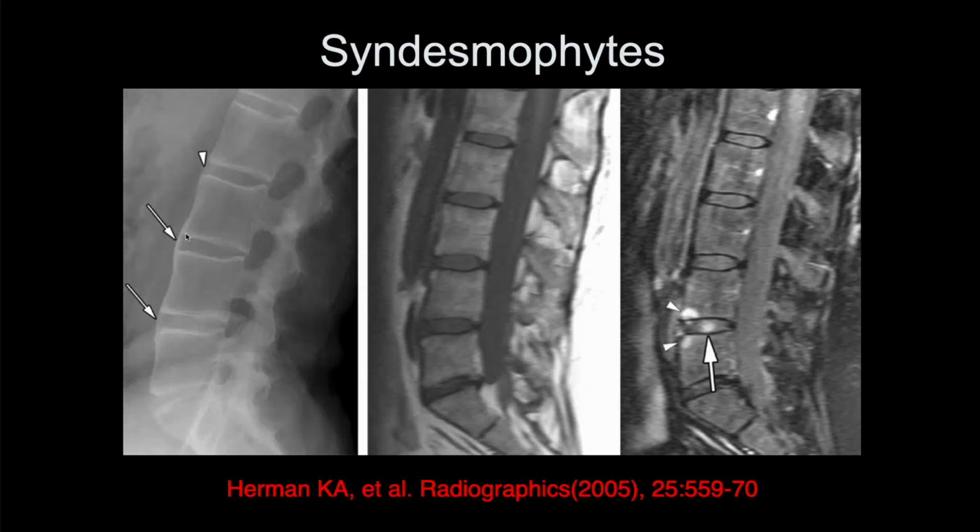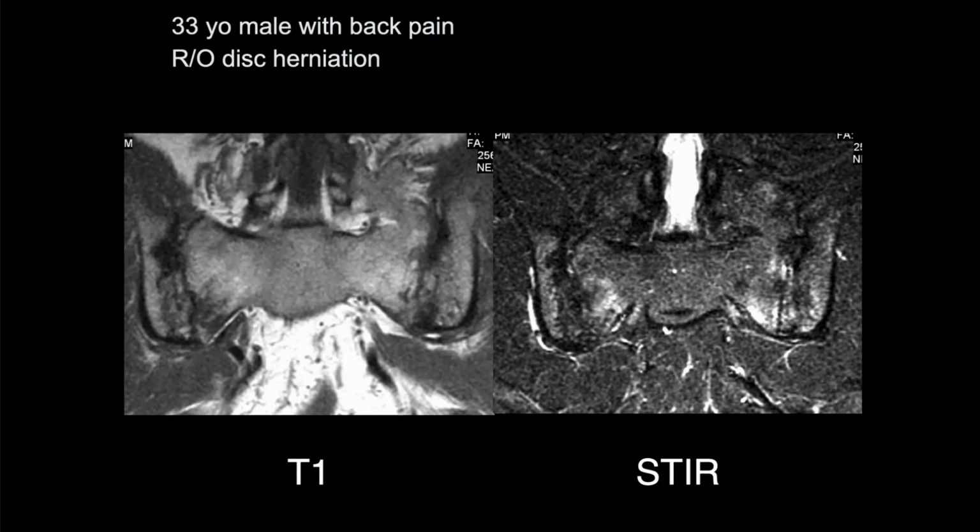And here's just another example showing the syndesmophytes, these nice thin ossifications, and how very difficult it is by MR often to see the syndesmophytes. And here we see the Romanus or shiny corner lesions, which we can see, which should make us very suspicious. But again, this is chronic disease. This isn't acute. You want to pick this up before you get the syndesmophytes, because obviously this patient has no motion at this level, or they'd fracture the syndesmophytes. So this patient has irreversible disease, and we missed the boat in treating this patient effectively.